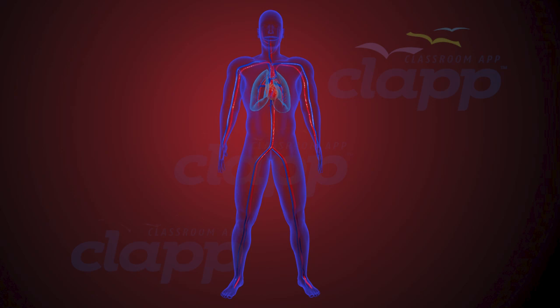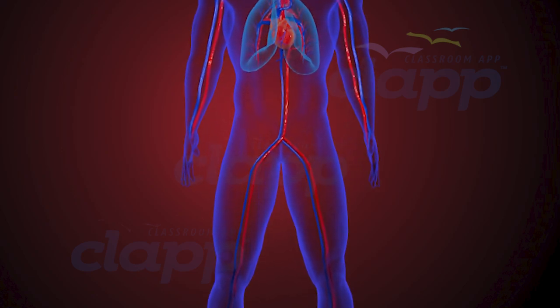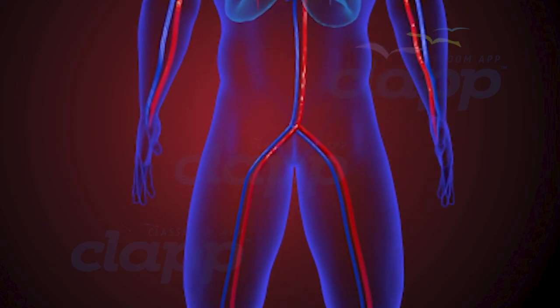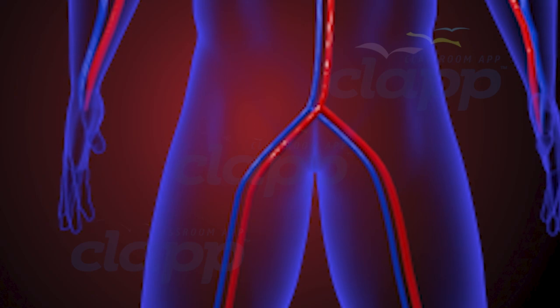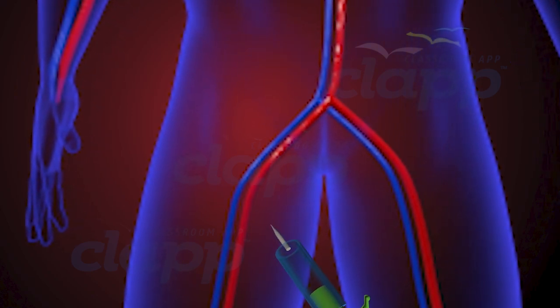The femoral artery approach, also known as the femoral approach or groin approach, involves accessing the arterial system through the femoral artery located in the groin area. This traditional approach is characterized by a larger catheter size capability, making it suitable for more complex procedures.